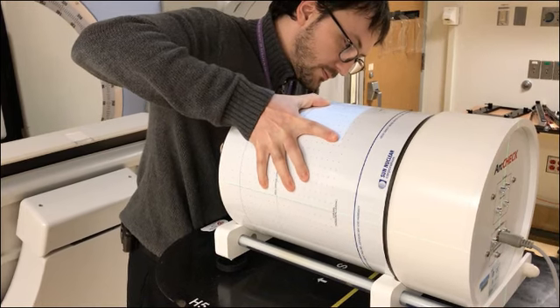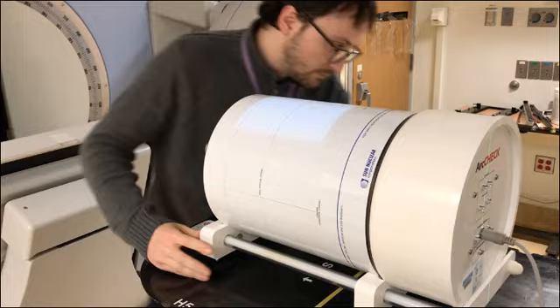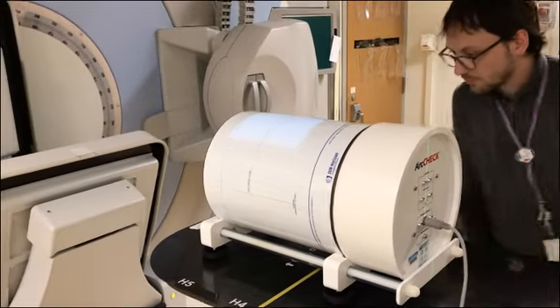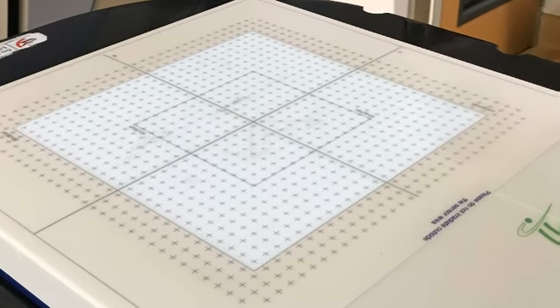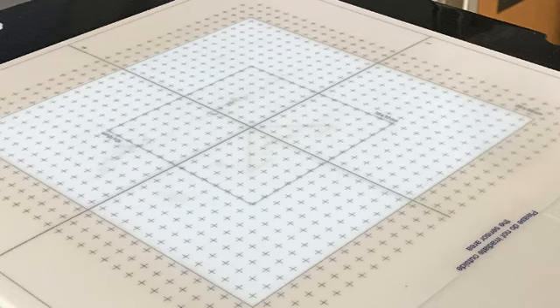So now I'd like to talk about some of the devices that are used to make these measurements. I showed you this one, the cylinder. I'm going to mention some vendor devices here. I don't really have any particular favorites. This one is an array of ionization chambers. It's a flat array. Distance between chambers is 7.6 millimeters.